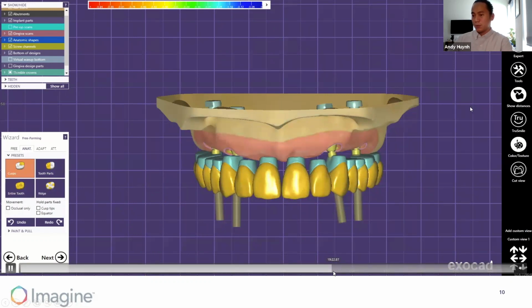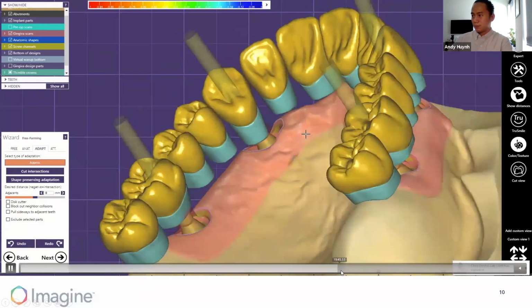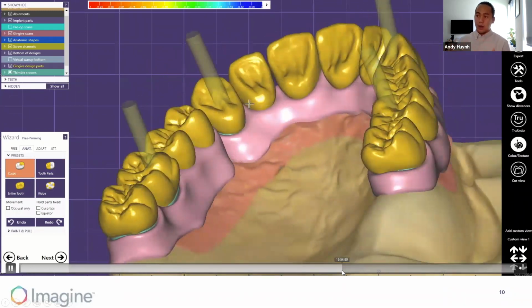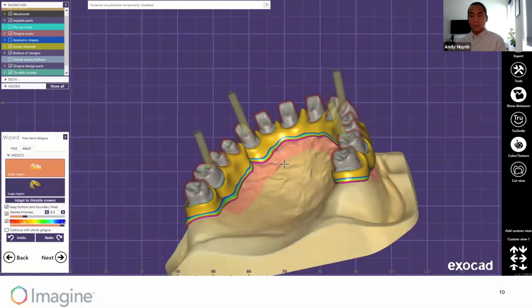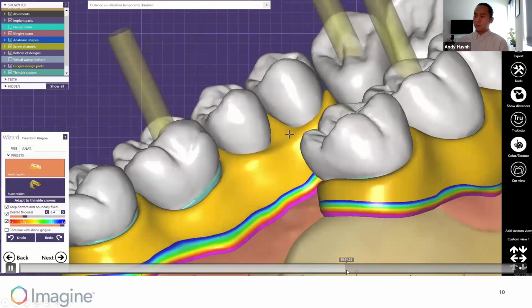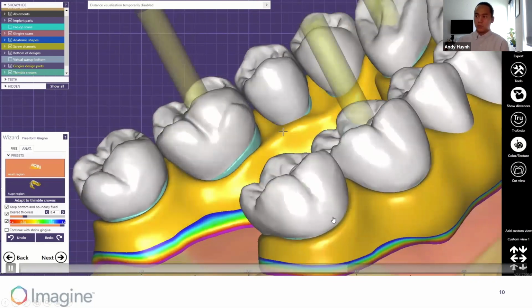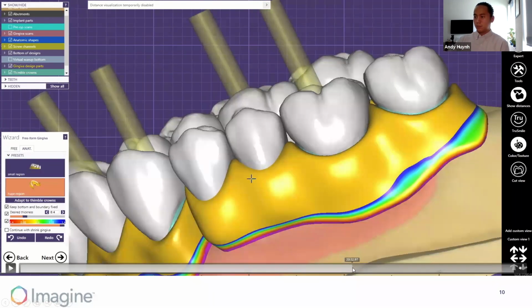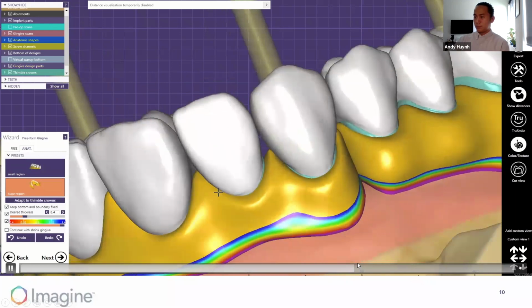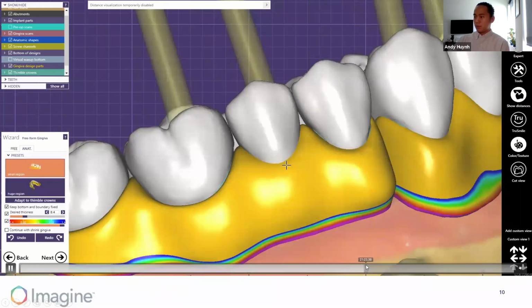Here is just another free-forming step once those crowns are finally generated. Okay. And again, once you adjust the crowns, you have the option to then freeform your gingiva again against your newly freeformed crowns. And again, this part is definitely all up to preference, but you can go supra or subgingival with your crown design. Okay, skipping ahead.